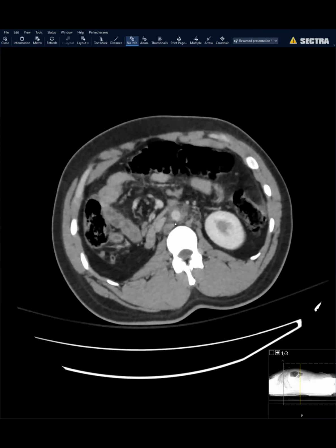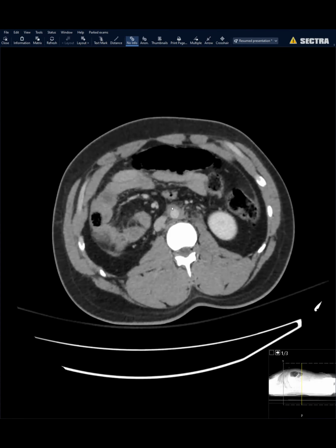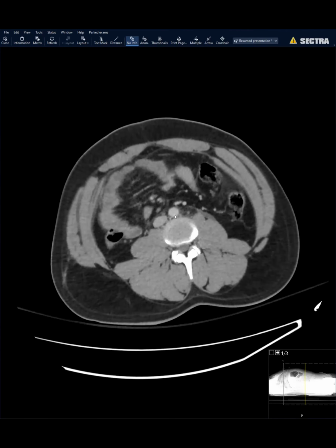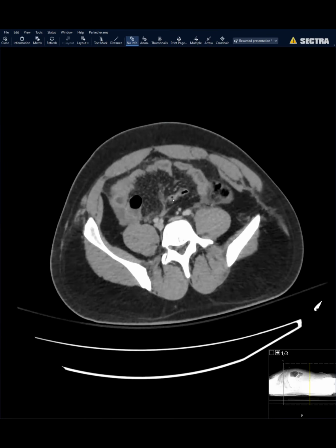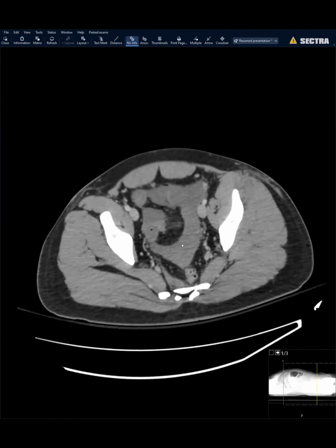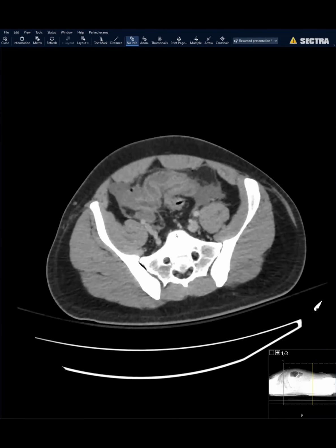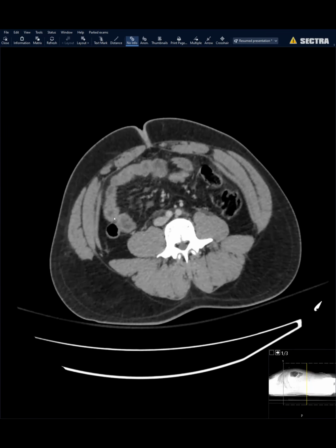Right, absolutely. So we knew that he had a significant trauma because you could see this retroperitoneal hemorrhage or fluid around the aorta, and you could see those few focal drops of air that I pointed out earlier. And he clearly has a lot of intraperitoneal hemorrhage. I think the teaching point on this particular case is that one needs to look very carefully for bowel pathology in patients with trauma.